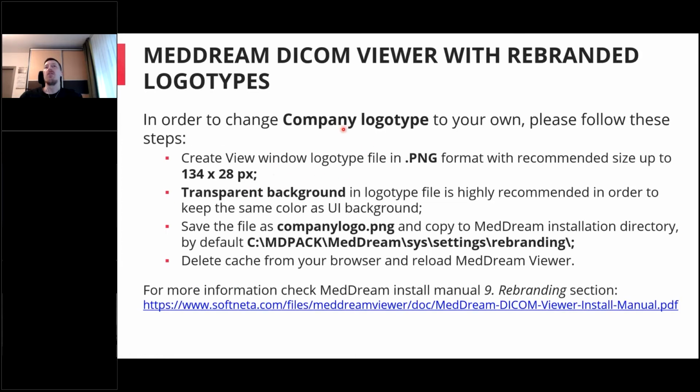And the last is the company logo, which is displayed in the about box. So also, as discussed, it is important to check the recommended size and make a logo as it is, make it company logo.png and put it to the branding.